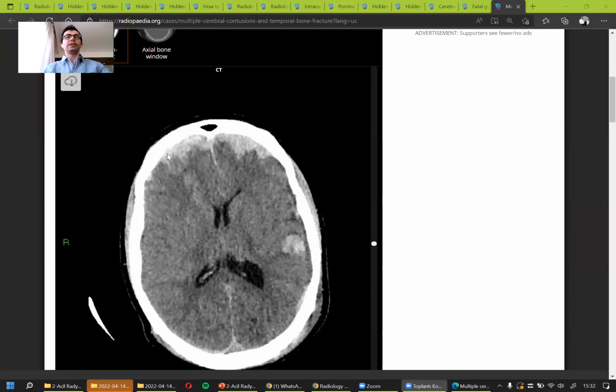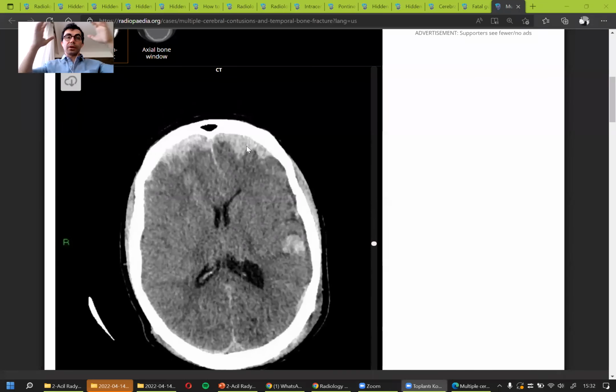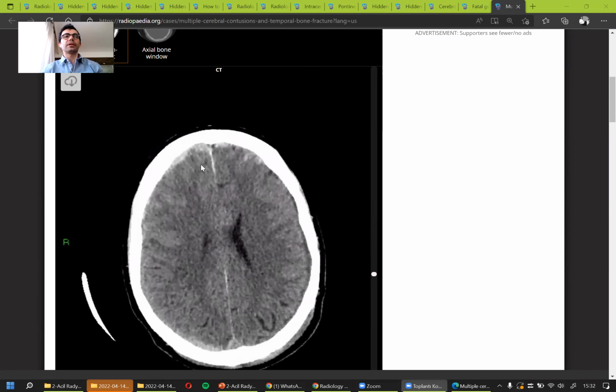What I'm seeing here is, I think, below the dura, and the dura is on the very periphery, below the dura but also below the arachnoid space as well. So it is actually within the cerebrospinal fluid. So what do we call the hemorrhage areas which are under the arachnoid space? Subarachnoid. Subarachnoid, right? So in this patient, we are seeing subarachnoid hemorrhage areas here.